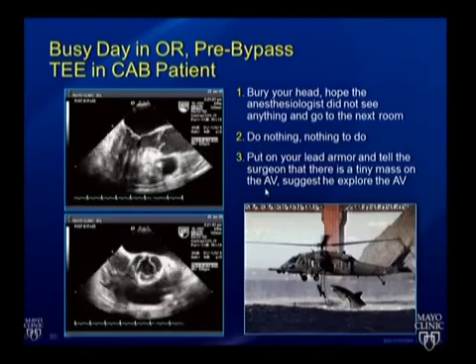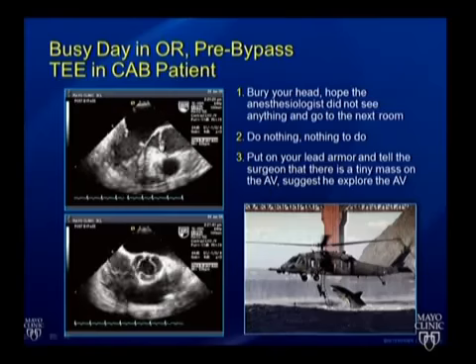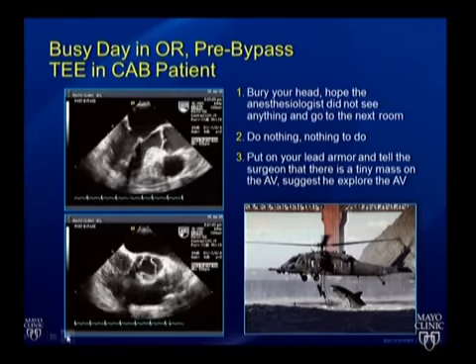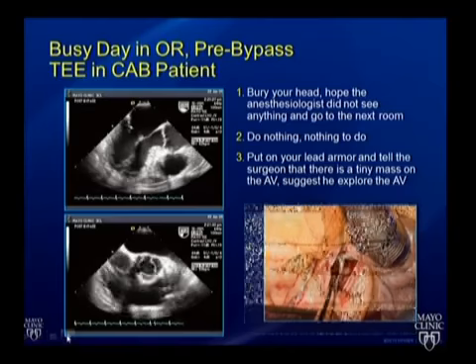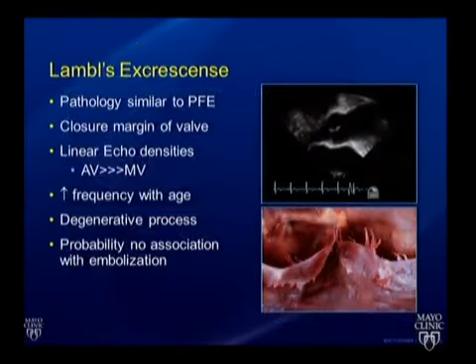Now, if you guys came to this lecture last year, I changed this case. So don't say anything. It's very subtle. Can you see it? Okay, it's hard because it's maybe not projecting as well. So what is it? It's a Lambl's excrescence. Well, he happened to be there anyway, so he took it off.